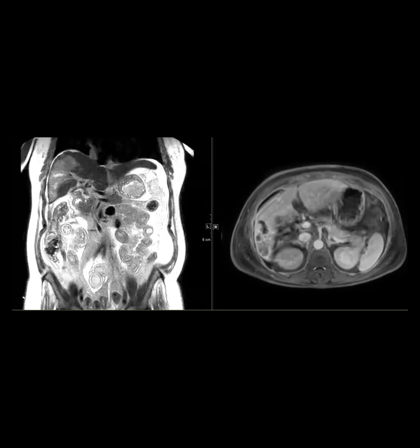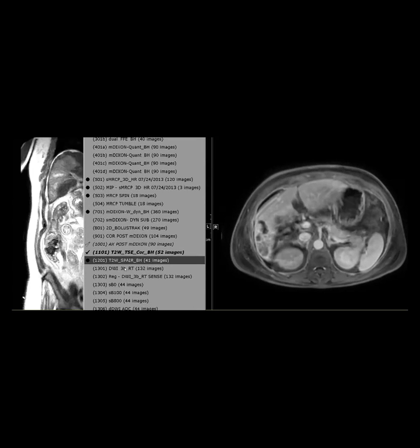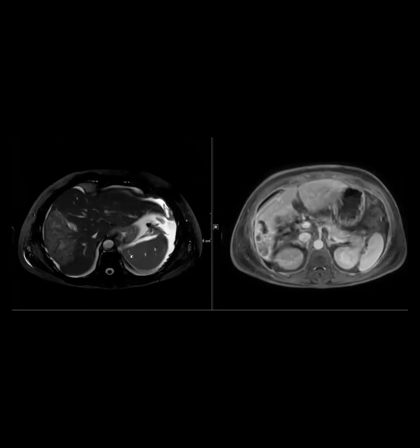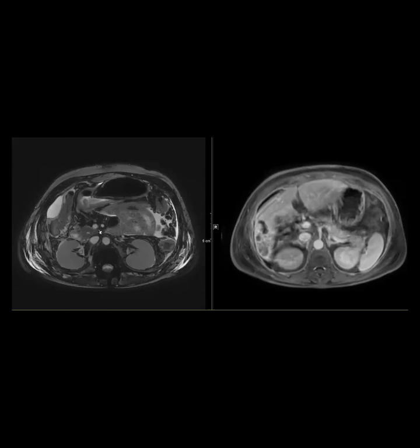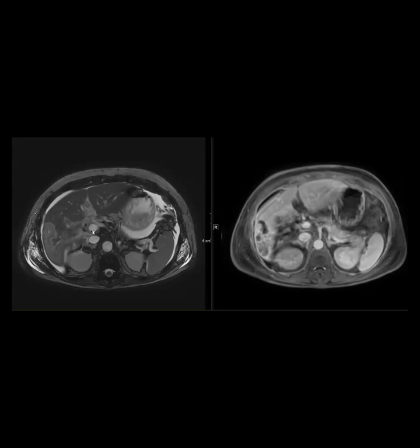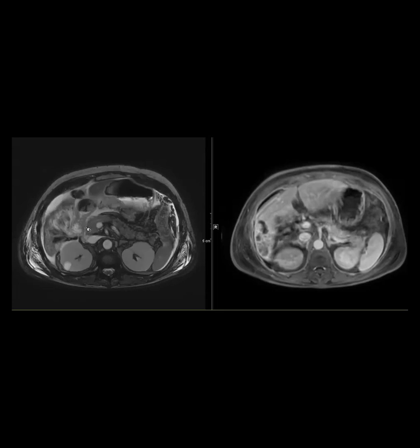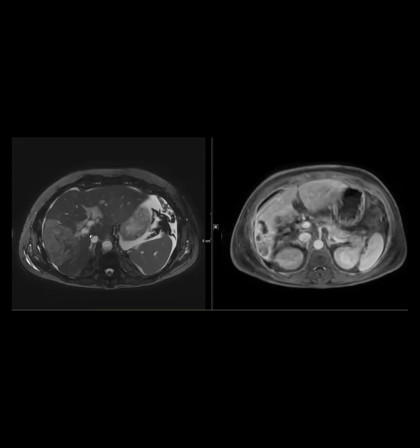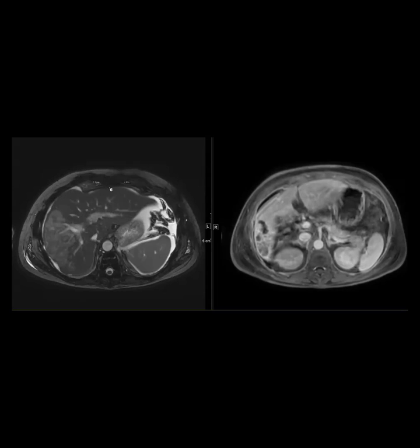It was a very interesting complication, and I've never seen this degree of complication from this, which was actually an open cholecystectomy. Again, you can see the distal common bile duct, and then it just disappears into the smoosh. On ERCP, the smoosh was a bile leak. They put a stent, and they're going to do a choledochoenterostomy.